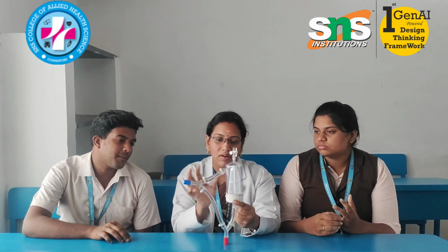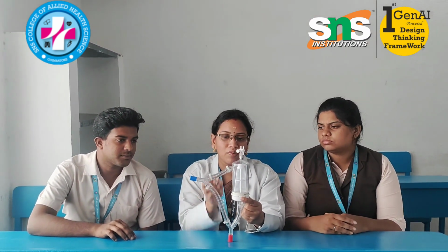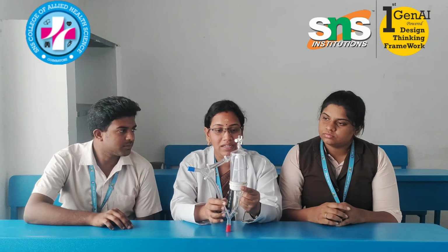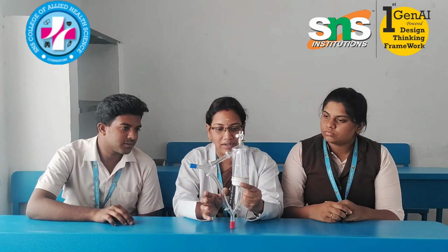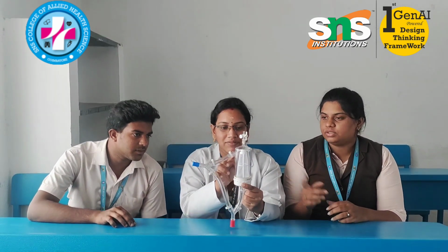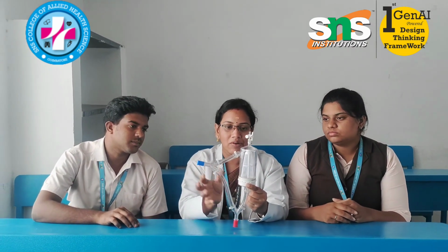The priming of this circuit is very important. Why? Because if you trap any air in the inlet or outlet, it will directly enter the arterial line of the patient. This is a disposable device, and it comes already ETO sterilized, but we cannot reuse this circuit. Why? Because the filters will hold micro particles, fat embolism or blood debris, so we cannot use it as a reusable item.